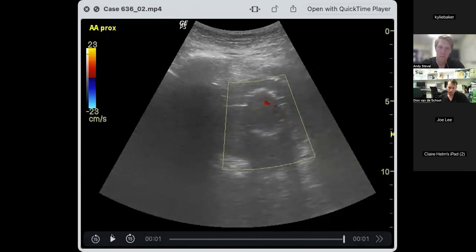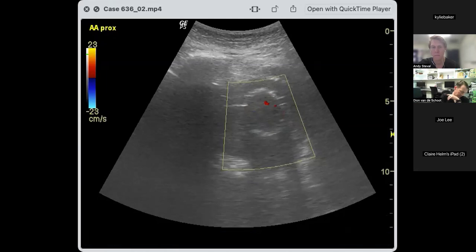So what are the sorts of things that you might be thinking about looking for, given what I've said, that we're going to be looking at a stent? This was somebody who, that's right, had a previously known stent leak. They had an attempted repair with glue to embolize the leak.